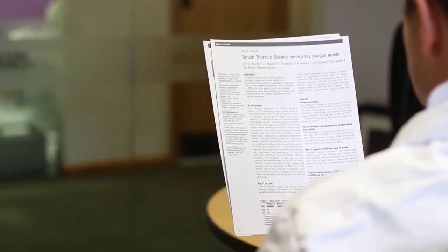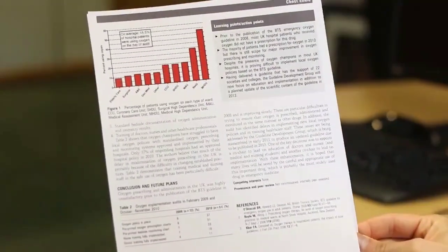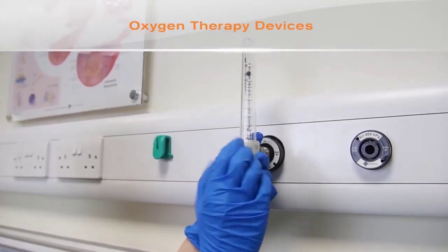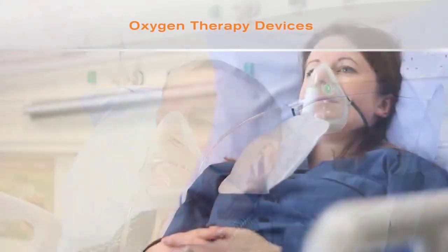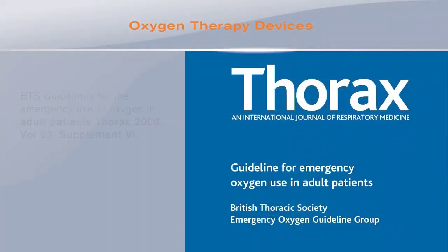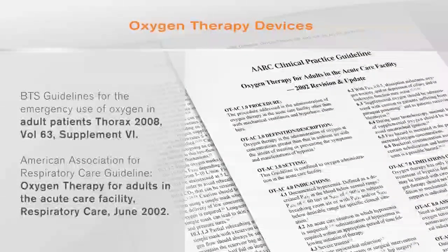Papers have shown that amongst practicing trainee doctors and nurses, there is a lack of knowledge about oxygen therapy devices and their correct use. There are also many false beliefs, with the result that many patients on general wards are incorrectly treated. This video covers the main types of device commonly used for delivering oxygen therapy, which enable clinicians to comply with guidelines published worldwide, such as the British Thoracic Society Guidelines and the American Association for Respiratory Care Guideline.